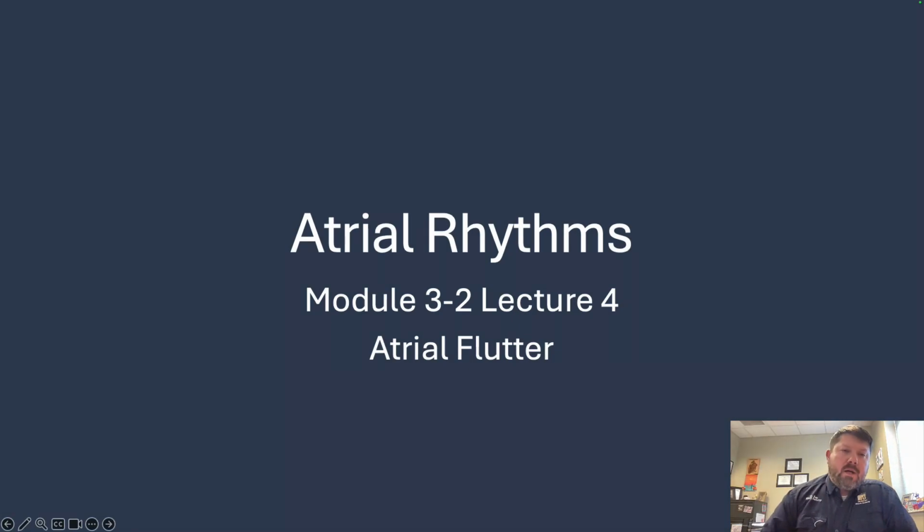Atrial flutter. So atrial flutter is going to be one of those rhythms that I mentioned before that you may want to make assumptions about, because a lot of times once you see that here, it's going to be pretty easy and it's going to stand out. But again, I do encourage you to always follow your 5 steps when you're interpreting these rhythms.